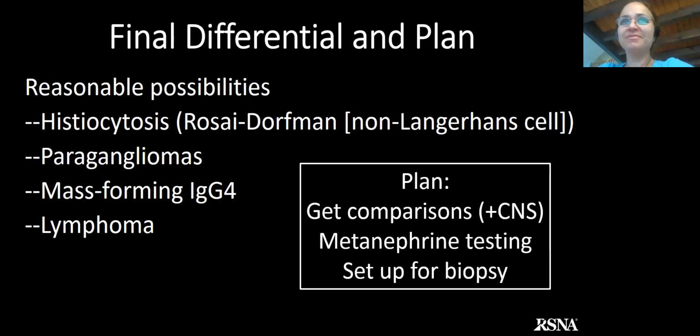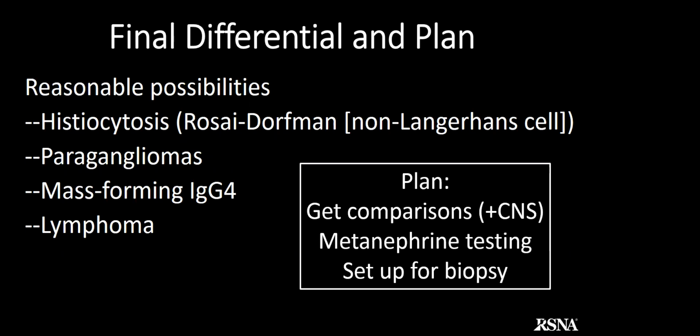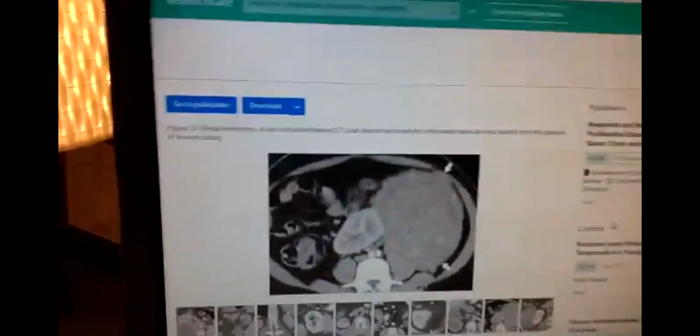Yeah, please do. Actually, maybe I can share. Just share screen. I'll stop my share. Can you see it? Yeah, a big mass. Oh yeah. But it looks kind of heterogeneous, like yours, right? Yeah. So anyway, fumarate hydratase.